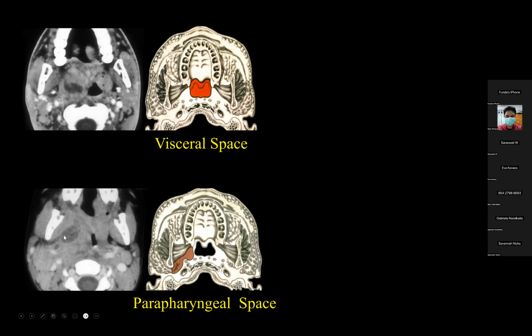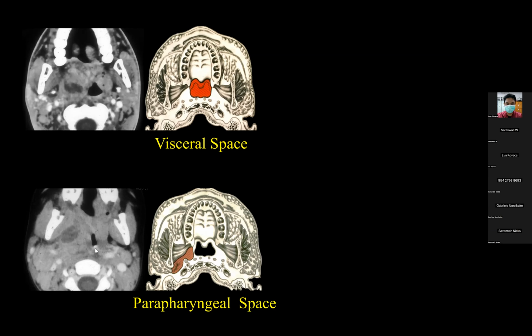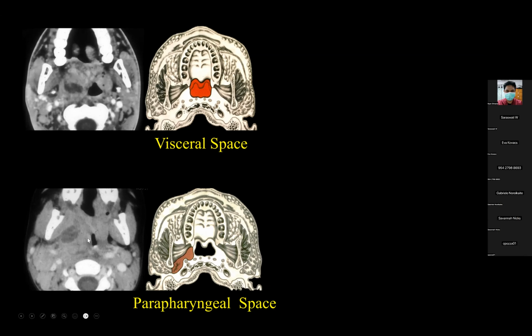But on the other hand, if we say that this is in the parapharyngeal space, notice how it's obliterating the parapharyngeal space. And look here, see how the normal parapharyngeal space is here? Notice how it's not there, and here on the left, it's symmetric. If we say that this is in the parapharyngeal space, then you would have to do a cervical approach. In fact, like I said, life's about storytelling. I remember this case. This is back when I was at UNC, again, in the last century. One of our superb residents, actually a terrific resident, it was read out initially as a tonsillar abscess.